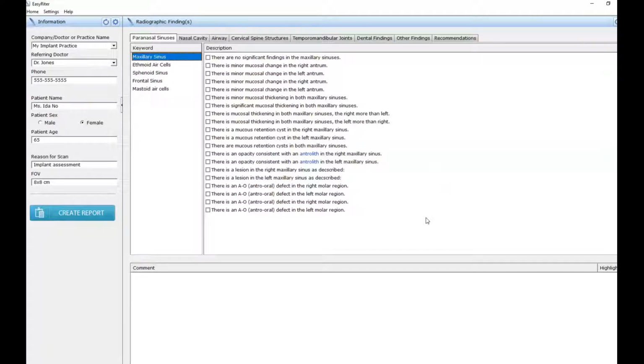In the 5 or 6 webinars and seminars I put up on drconebeam.com, we walk you through how to examine a scan. But for purposes of using this software, we're going to assume that you've got some images, and we're just going to make up some statements to show you how easily the actual report populates.